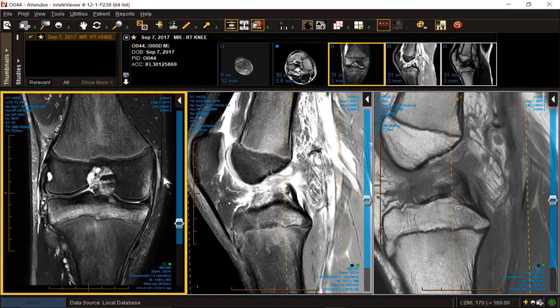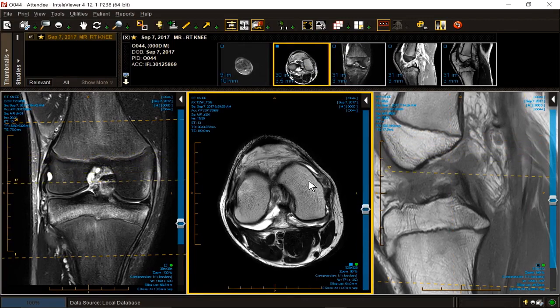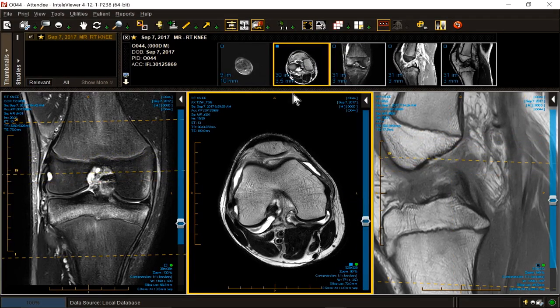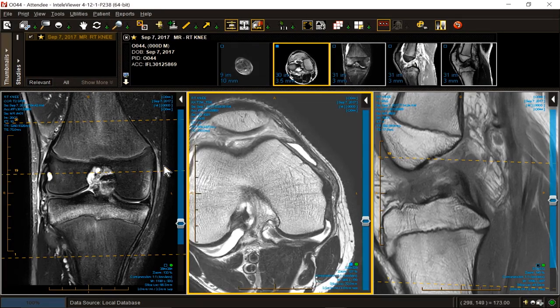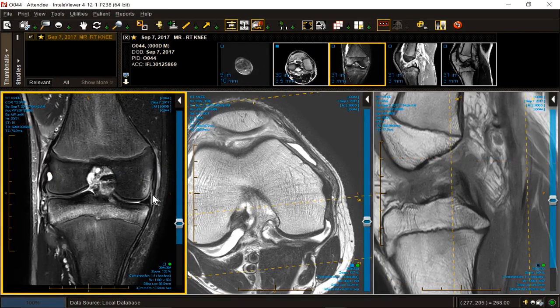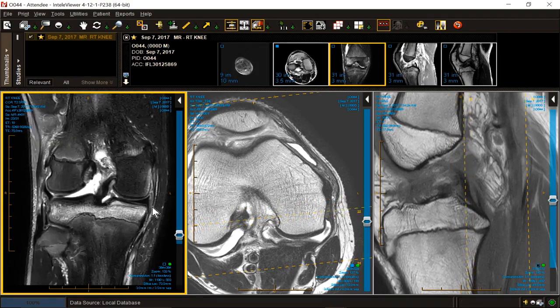We said we thought the superficial bundle was swollen in the axial. We were right. It is. Here it is right here. Let's blow it up. It should be about 1 millimeter in thickness. It's too gray. There it is, too white. The tibial collateral, pretty good. The meniscofemoral attachment, pretty good. The meniscotibial attachment, excellent. Let's go back a little bit.